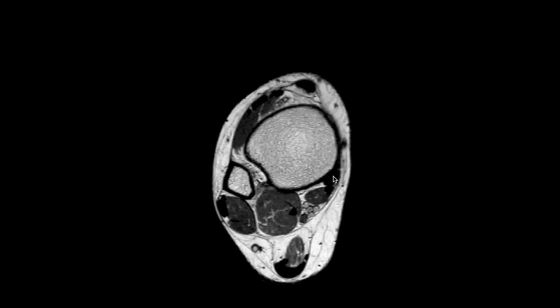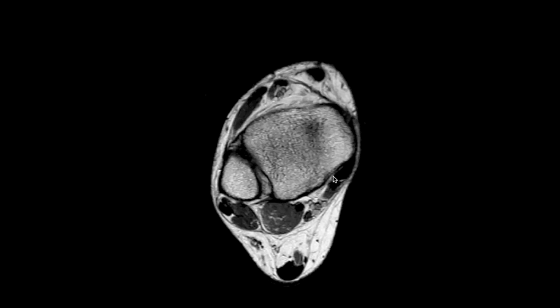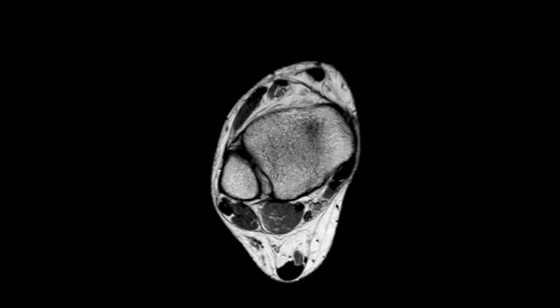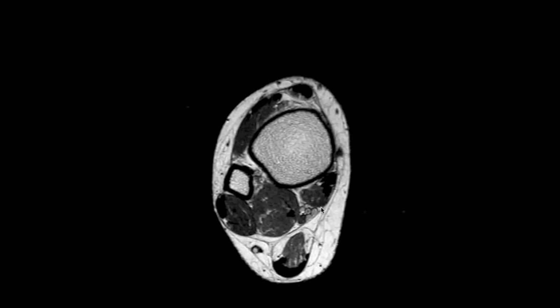There is the posterior tibial tendon. As we extend distally, the main attachment of the posterior tibial tendon will be the medial border of the navicular, but it also has smaller attachments along the plantar aspects of the first, second, and third cuneiforms, as well as the plantar bases of the second through fourth metatarsals, and also some fibers will reach the cuboid.